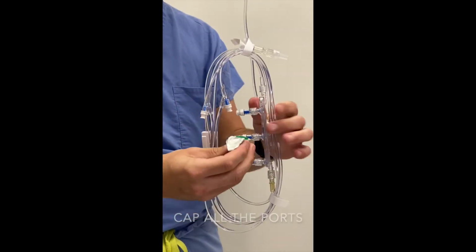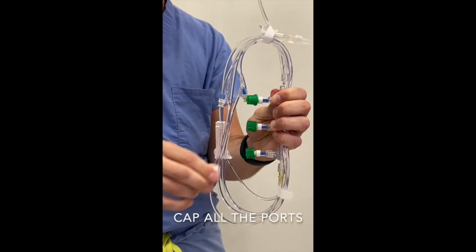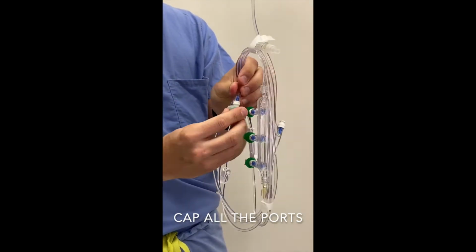At Georgetown, we take infection control very seriously. Be sure to cap each of the 6 ports on the IV tubing with a green alcohol cap and twist at least 2 times.